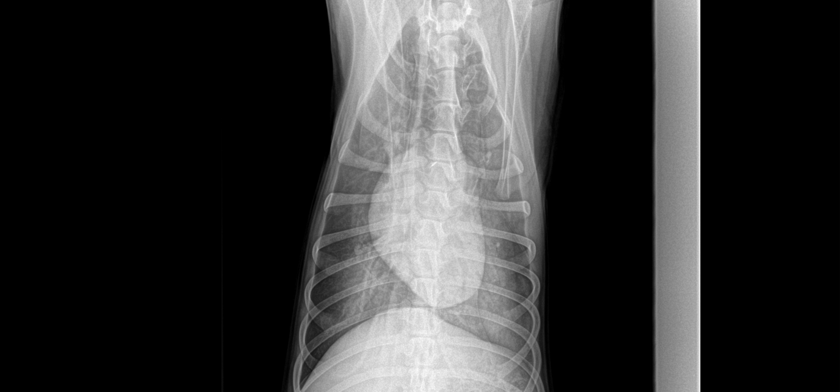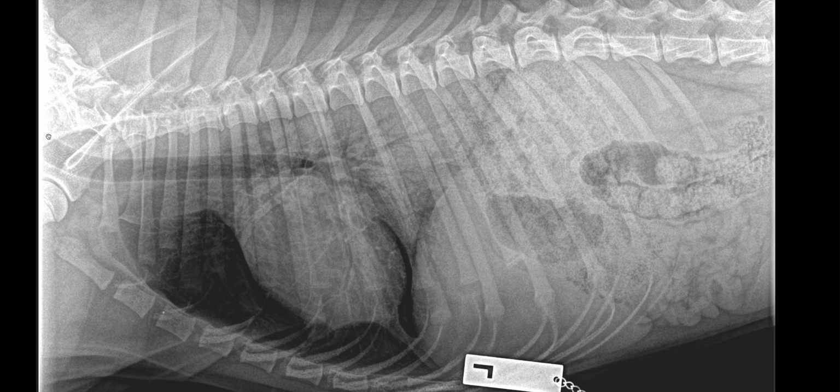So, in conclusion, the main finding of those radiographs is a caudal-dorsal severe interstitial to alveolar pattern of the lungs. And this dog presented with an acute history of respiratory distress and no signs of heart murmur. Therefore, the main differential diagnosis is non-cardiogenic edema, which can sometimes happen secondary to seizures, heat stroke, strangulation, electrocution, near drowning. So a lot of different causes can induce non-cardiogenic edema.